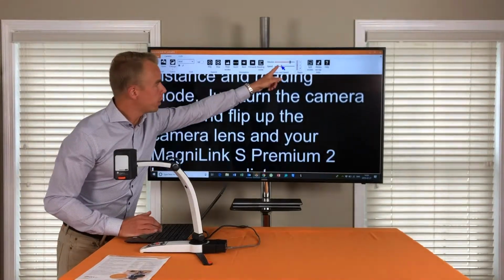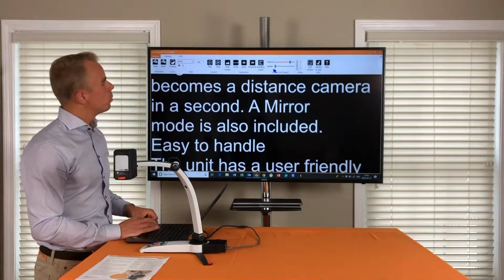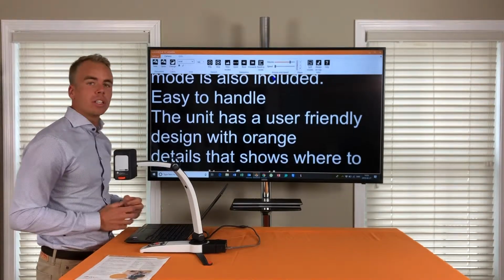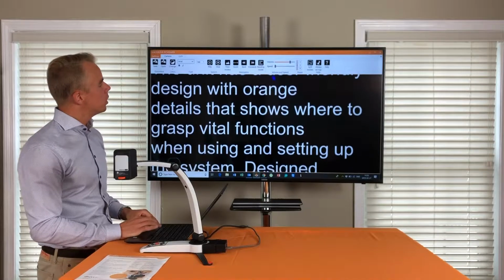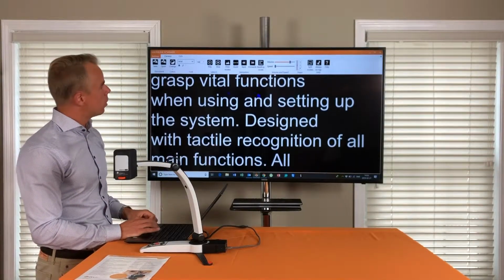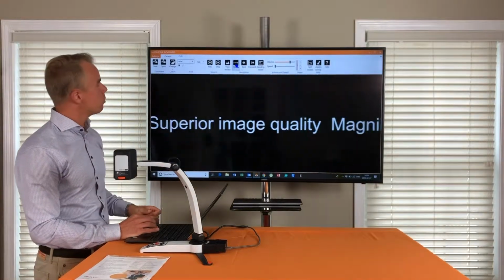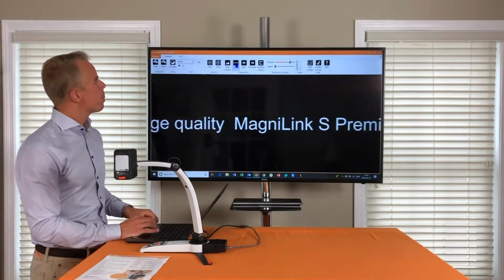You have a bar here that you can adjust the speed in any mode. So I can make it slower. I can also make it slower by pressing button number 6, make it faster by pressing button number 7 on my keyboard. So now we're following along in the text like that. I can also, by hitting N or the quiet icon again, follow the text like that as a sentence.